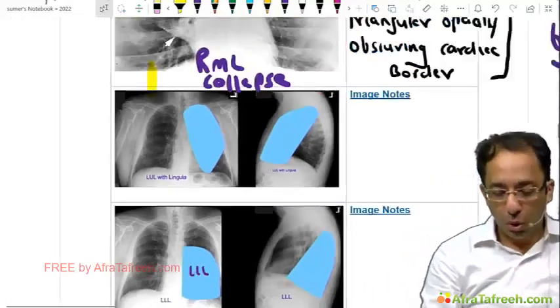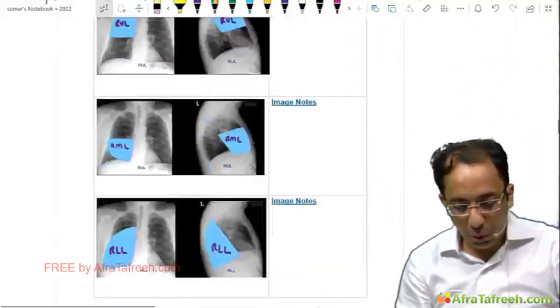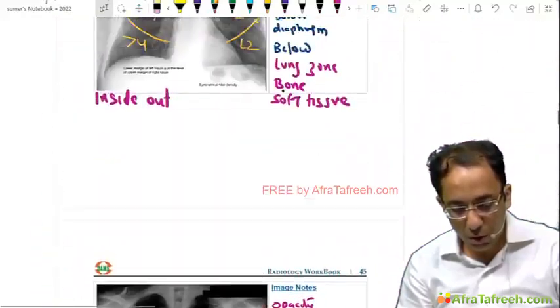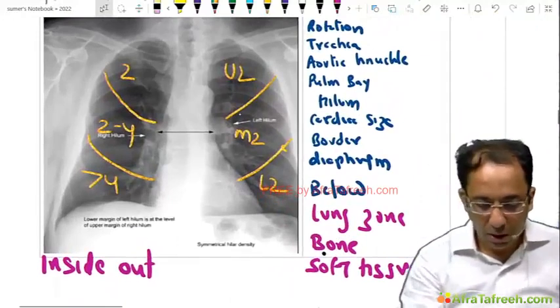Now I will ask you a question. Let's see if you can answer. Okay, I'm going back to the X-ray, very, very slowly. Don't panic. Relax. Now, anybody?